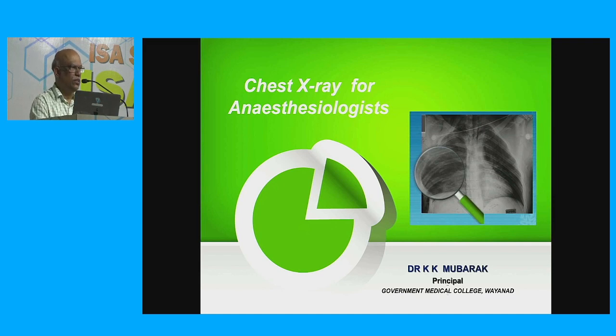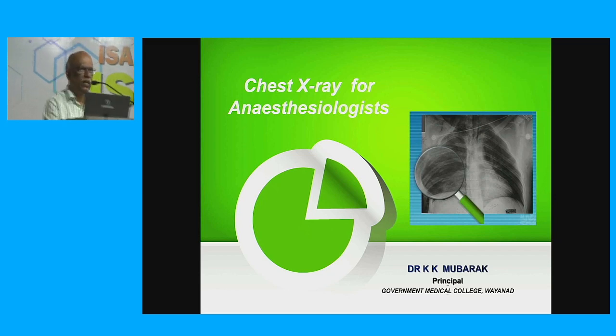Then before interpreting a chest X-ray, you should know why I ask for a chest X-ray. What is this X-ray for? For example, a child with a foreign body in the bronchus, a preoperative chest X-ray of a routine patient, and an elderly patient, we look at from different angles. So we should know why we are looking at the chest X-rays.